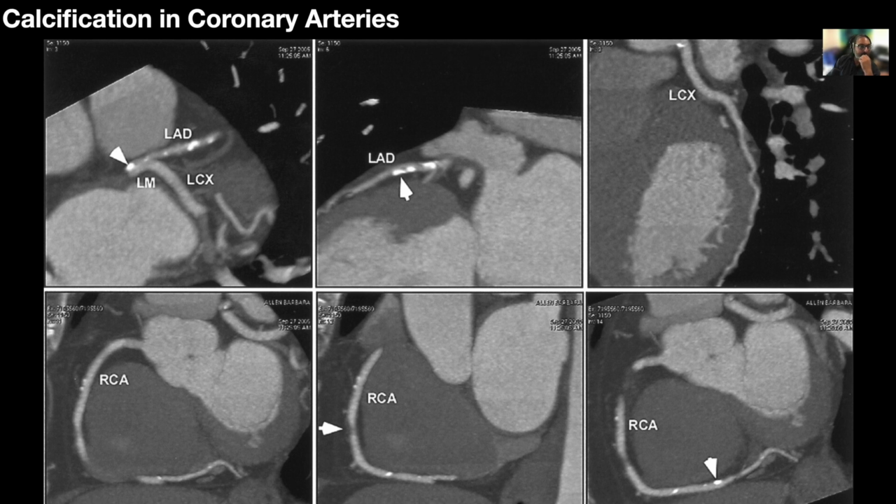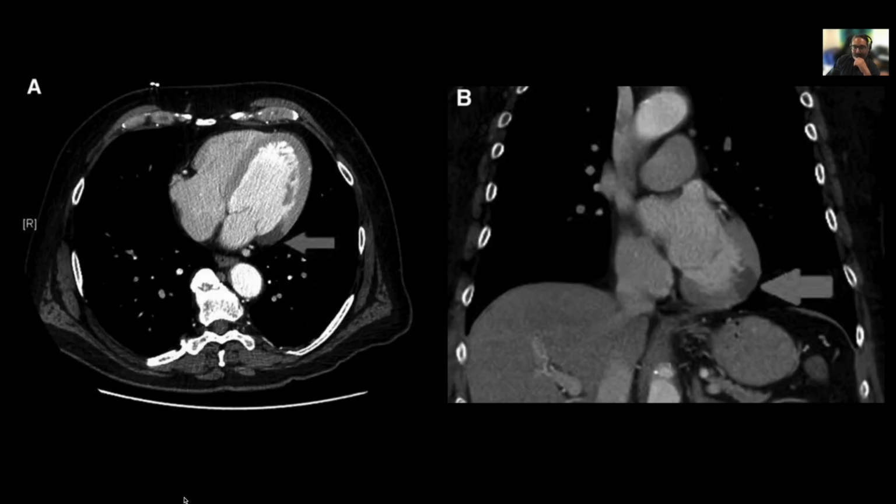There are some more interesting things here. What can you see here? And what they're pointing at is this. Do you see this darkening of the color? Look at the remaining wall, and this part is darker. You see the same here. So I'd probably say the stenosis probably caused a full STEMI, because it looks like an ischemic patch, and it looks like it's gone through the entire wall. Correct. So that's myocardial ischemia, potentially infarction. You can see that on the CT.